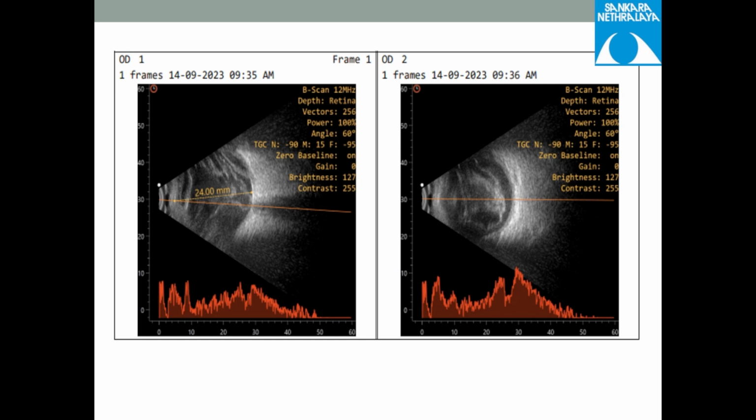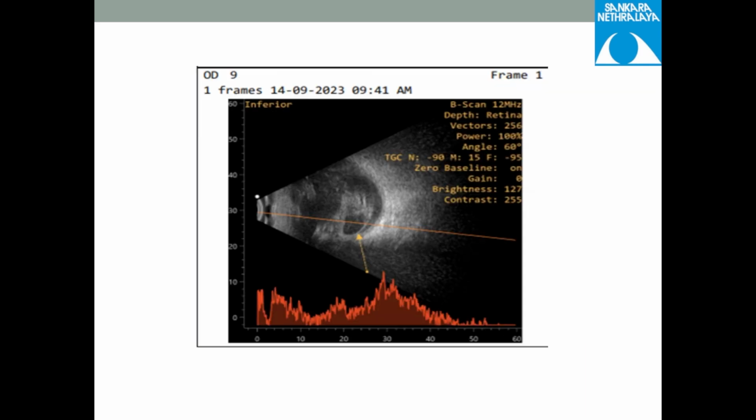The first image is an axial scan, where the lens echo is not noted, and the vitreous cavity has a lot of dot echoes and also some membrane echoes. We can't comment upon the aftermovements. There is a membrane echo arising from and attaching to the ONH, extending to the periphery, and there is a localized dome-shaped echo in the superior part of the scan. There is a globular structure seen in the inferior part, which could be a dislocated lens. Okay, go to the next.